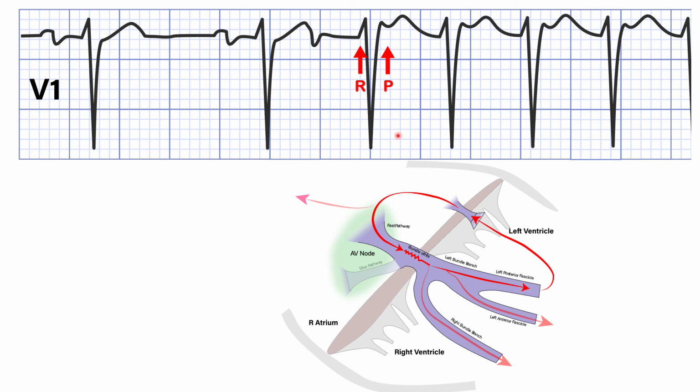Next, let's look at AVRT as a possibility. In AVRT, the signal must pass through the AV node, depolarize both ventricles, before it can turn around and re-engage the accessory pathway to create another P wave. Generally in AVRT, the P wave must be separated from the QRS. So a lot of electrophysiologists would look at this and say the VA time here is much too short for it to be AVRT, so it can be safely ruled out.